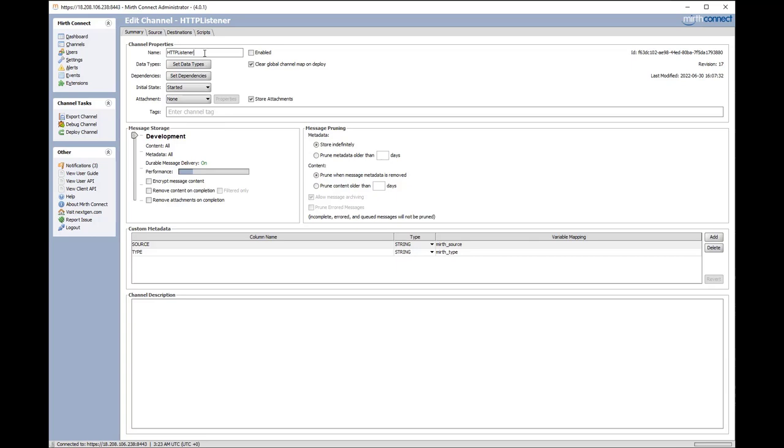This is going to be just the name of the channel. We can give it some descriptive name. The only stipulation is we need the name to only consist of alphanumeric characters, spaces, hyphens, and underscores. Notice I didn't say any special characters, so maybe an @ symbol. I just clicked an @ symbol, and you can see how it won't even let me add that. If I click a 2, it'll let me add the 2, but I can't click an @, exclamation point, hashtag, or $. It only can be alphanumeric characters, spaces, hyphens, and underscores.